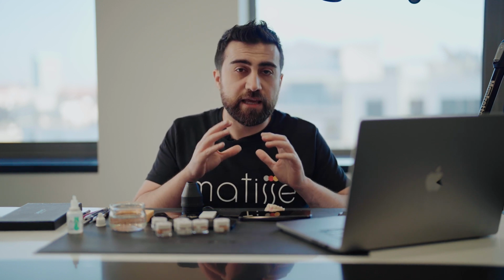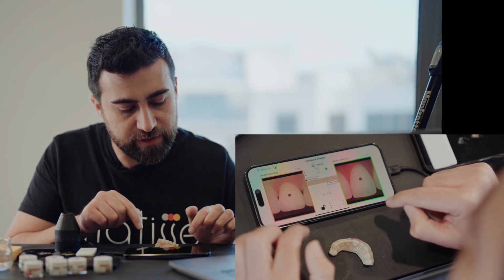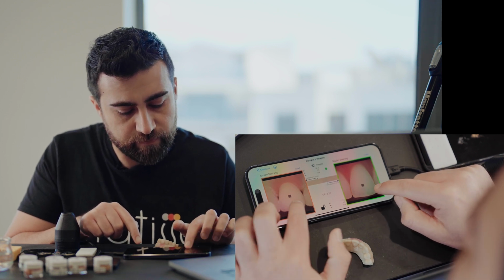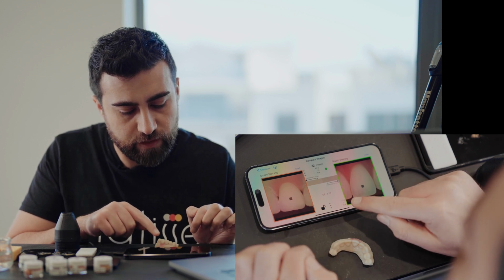So now the paste is still wet on the crown. And I can add a little bit more or remove and perfect it before firing it. So here it's 2.2 and I can add a little bit more chroma, so I can use the same staining recipe and apply a little bit more. Also in the middle I can apply a little bit more. Incisally as well.